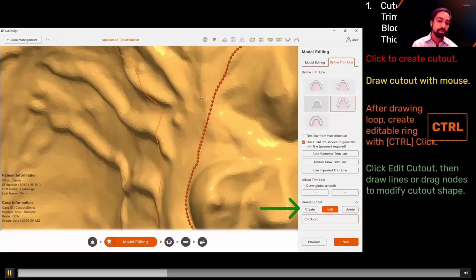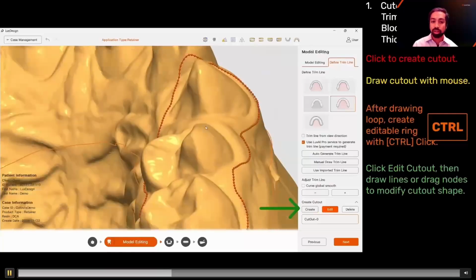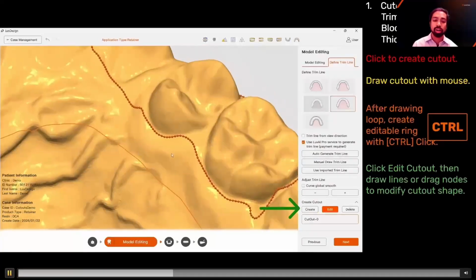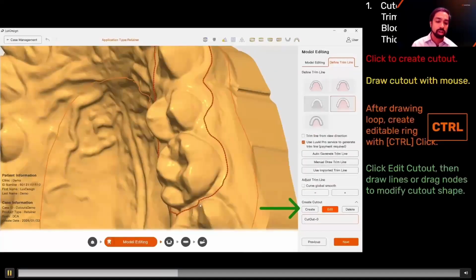You may want to go a little bit more aggressive. You know your patient better than I do. If you feel like you could make a smaller box, a thinner device, then go for it. I know plenty of patients have, and we'll go over some examples where that was the case.